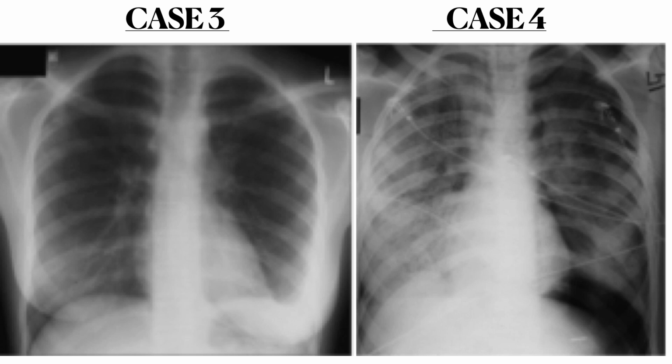Then in the third case, we see some lamellar component or congregation also present. We also note that on the left side, the left costophrenic angle is obscured due to accumulation of fluid in this area. So all these features are related to a pleural effusion.